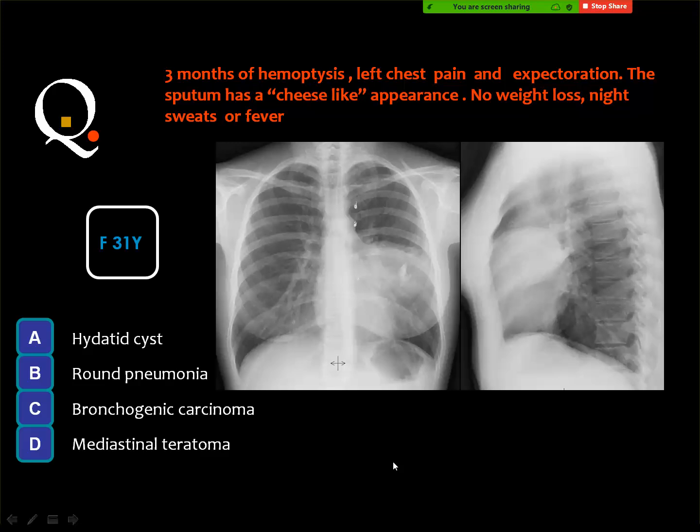No, and I have mentioned many times to the clinicians, do not look for any sentence mentioning atelectatic bands. It means nothing. It means an old scar in the lung. But we usually write it in the report to show that we have seen this particular lesion. It does not mean anything, and it's better to avoid writing atelectatic bands, especially in major events.